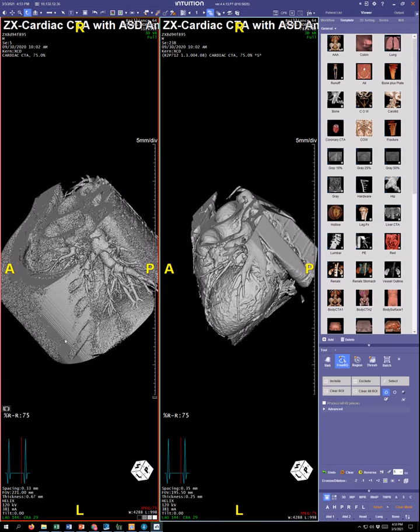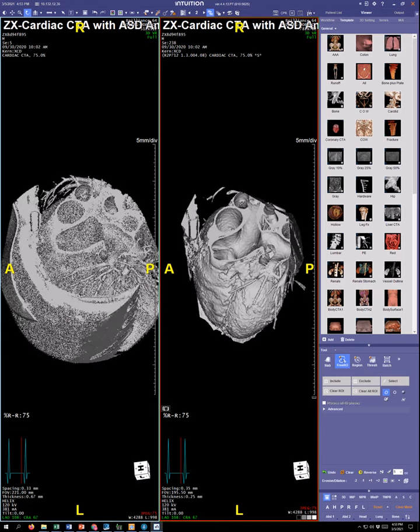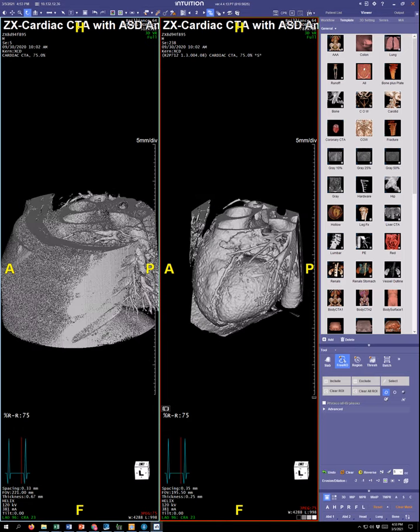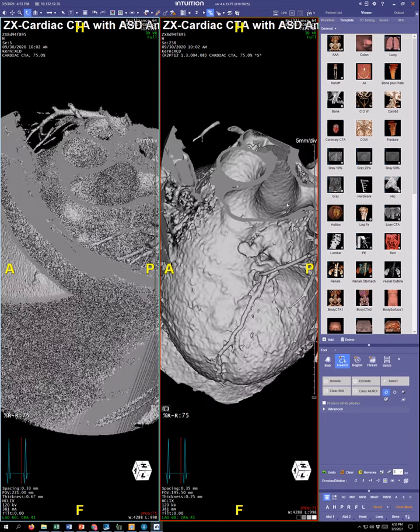The point here, though, is, of course, that you can't print noise, and you can't segment noise well either. So this is why we're using Pixelshine denoising for all our preparation for 3D printing. That's pretty impressive, and the prints look just as good.